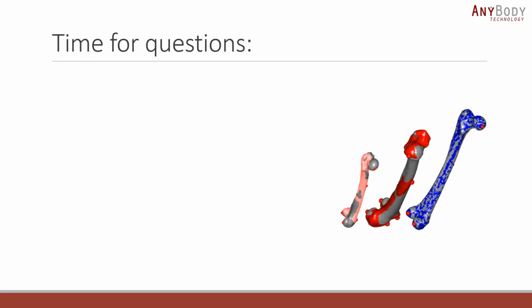Another question is, could we clarify how we can unify the number of vertices for the target and source segments? So one way to do this is actually to do an RBF scaling of the target bone back into the source bone, and this way we will get the right topology.